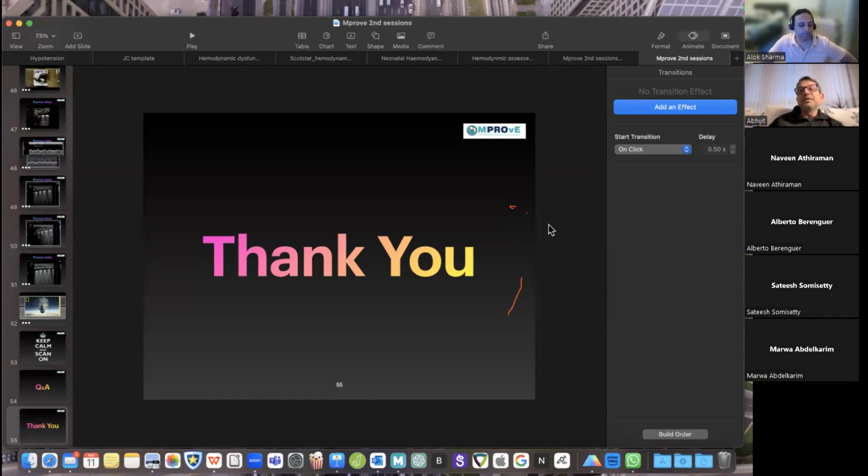Still, we don't. There have been studies trying to figure that out. There's a Canadian group who's mostly on it. But for all practical purposes, at this point of time, the answer is no. And I think the message has got lost here. I'm not saying that when you see vertical lines there, you have overinflation. What I'm trying to emphasize is if you are seeing vertical projections coming down from the pleural line, I don't care if it is lung comets or lung rockets or B lines, there is some lung there. So that's not pneumothorax is what I meant. But you are seeing a mirror image there. So what can give you a mirror image? A normal lung can give you a mirror image.